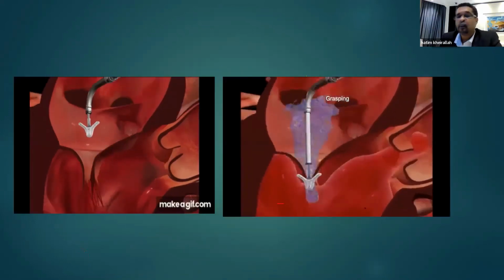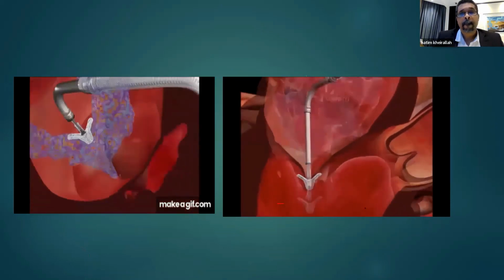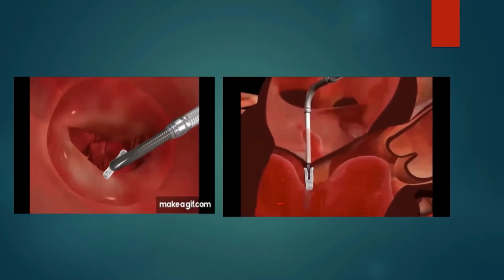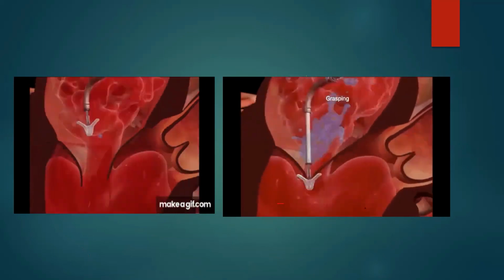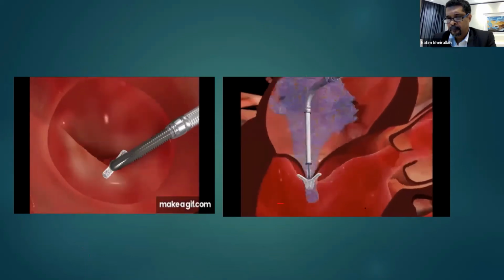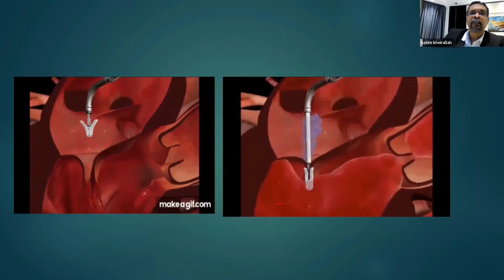Okay. Now, what is this? Mitral clip. Good. This is mitral clip, and I brought this one here for explanation because it's important.